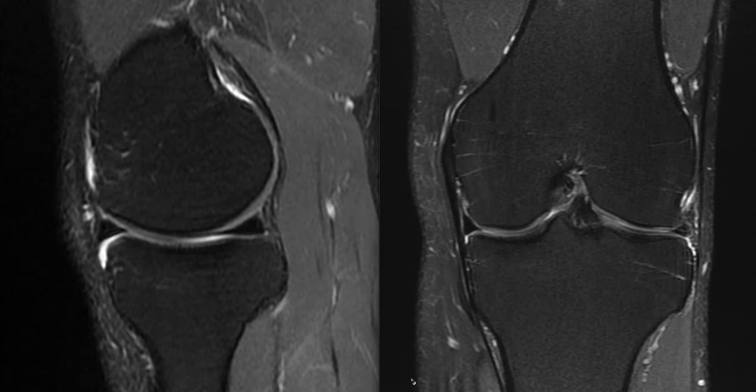In a previous video, we talked about simple meniscal tears, that is, linear tears with a horizontal, longitudinal, or radial configuration. In this video, I want to discuss more complex tears, and particularly to focus on meniscal tears where a fragment of meniscal tissue has become displaced.